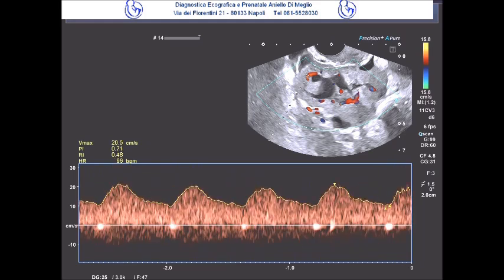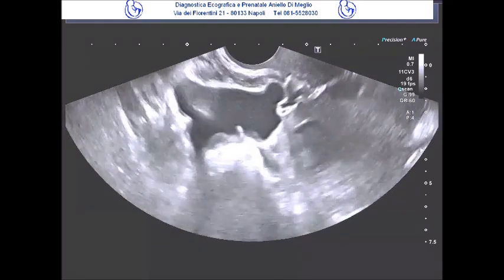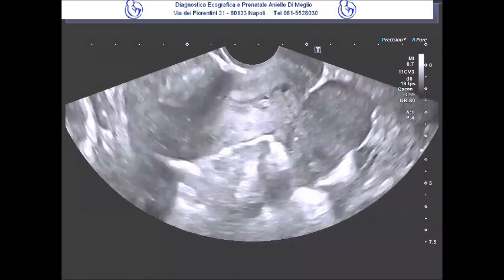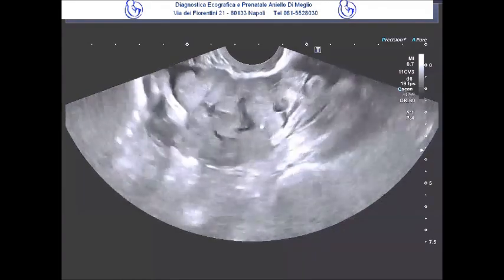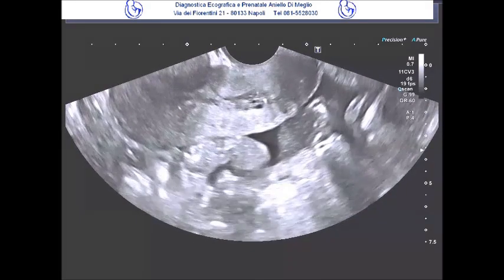And this, of course, significantly fits into the complex history of ovarian cancer, which is, let's say, a malignant tumor that grows relatively quickly and aggressively compared to other conditions often found in the female genital area. But here and in the following images, you'll see how the ovarian masses, the ovaries, are extremely enlarged.